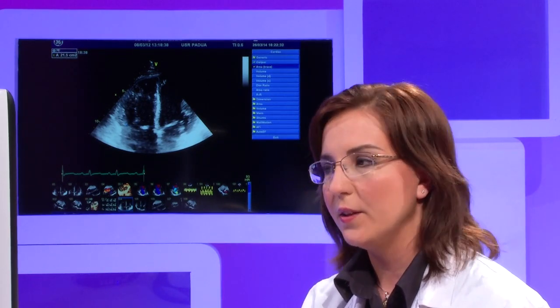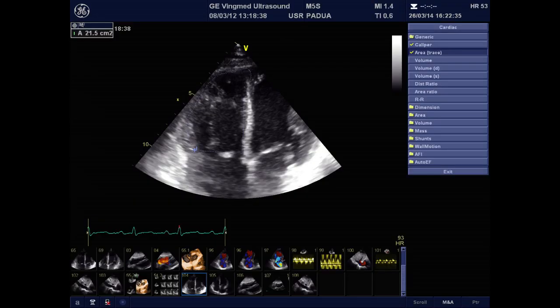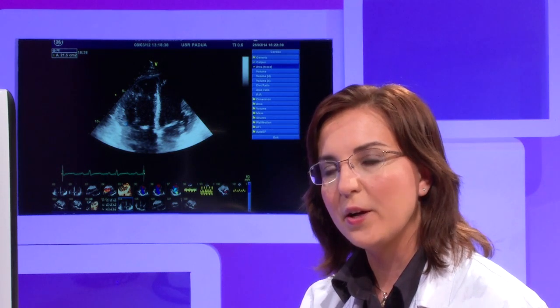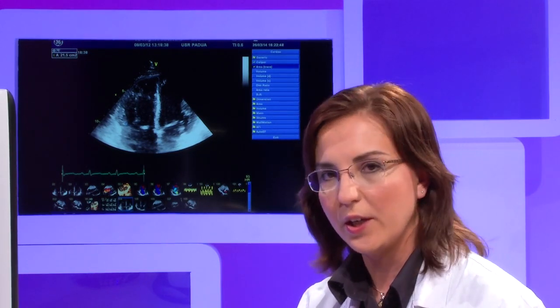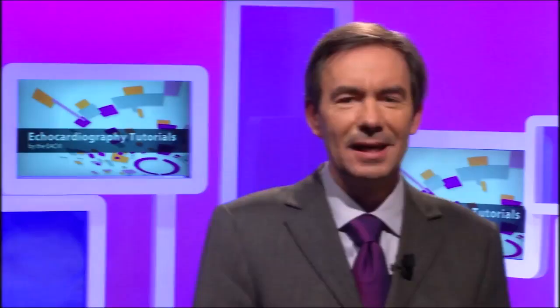In this case, given the fact that the patient has a heart transplant and has performed a recent biopsy, the most probable mechanism is a traumatic lesion of the subvalvular apparatus, which led to a severe tricuspid regurgitation. So in conclusion, you see that it's very important to have an integrative and comprehensive approach using different views, different techniques in order to assess this primary tricuspid regurgitation.